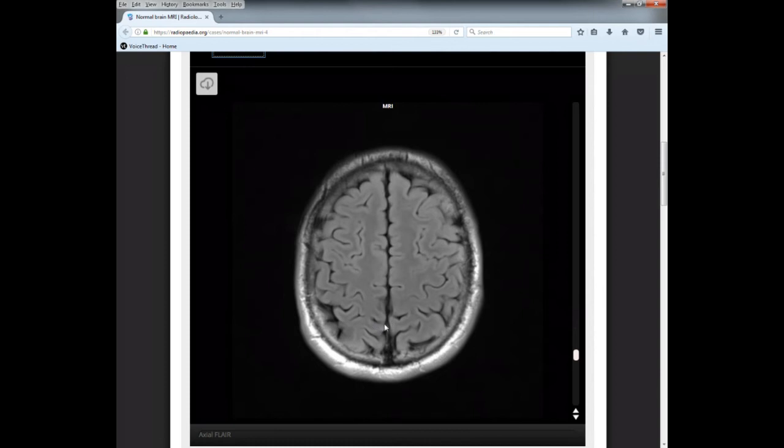And then what you want to do is once you find this mustache, you want to go up and to the left, and then up and to the right of the cingulate sulcus, and you're going to find the central sulcus. See this long sulcus here? Okay, not quite a fissure, but it's a pretty long groove there, okay? Here's your right side, up and to the left, central sulcus, okay? The central sulcus separates the frontal lobe from the parietal lobe, okay?